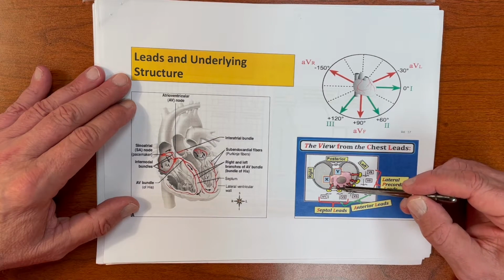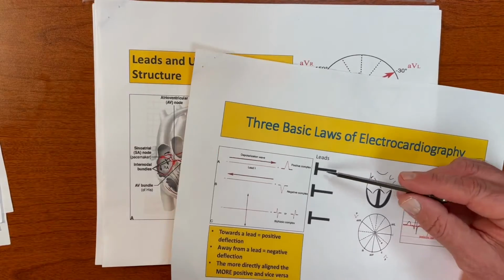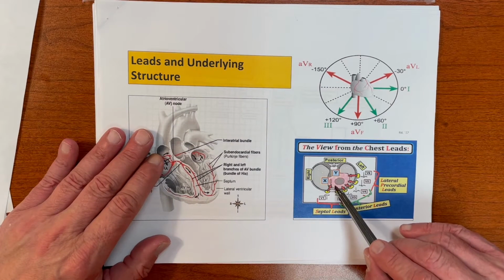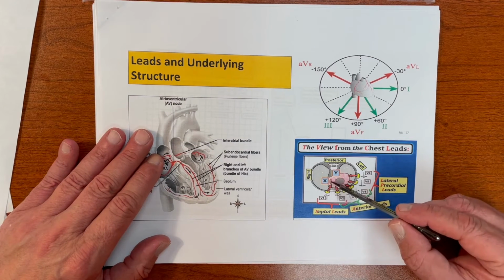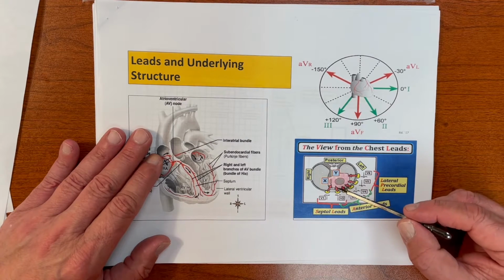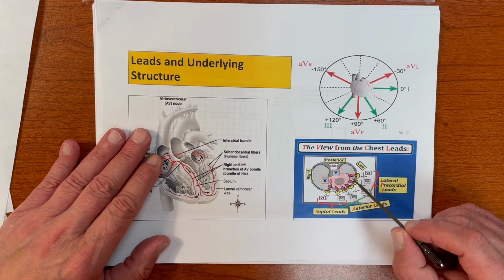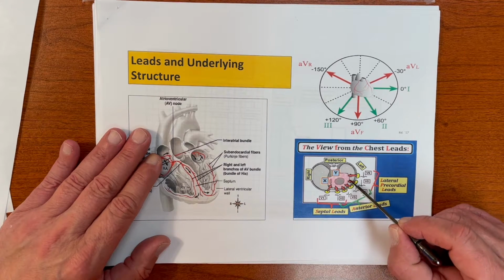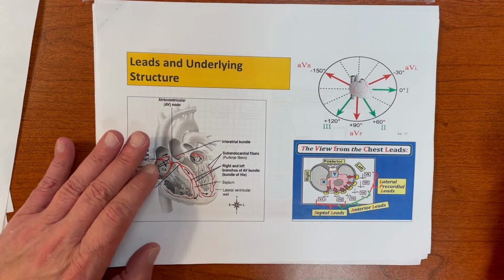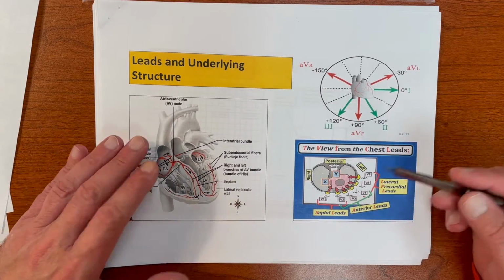Therefore, they're looking pretty directly. Notice the arrows, that's the counterpart, that flat part of this lead. The arrows are looking at that surface more directly. Notice the right ventricle, small and to the right. As we go through the precordial leads to V6, we go over more and more and more of the left ventricle. Okay, all right. So how are we going to use this, maybe looking ahead?